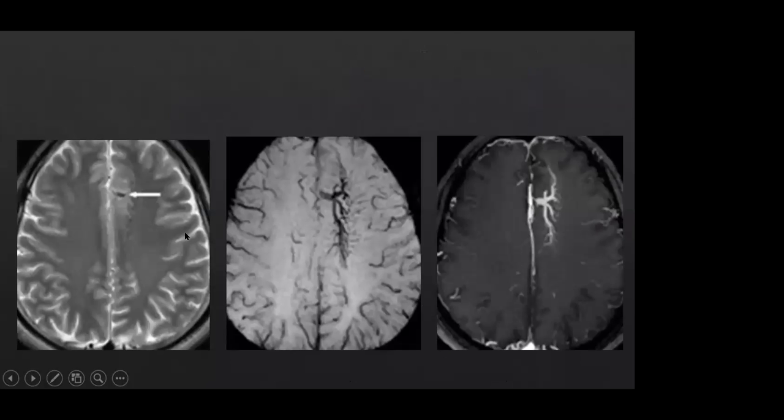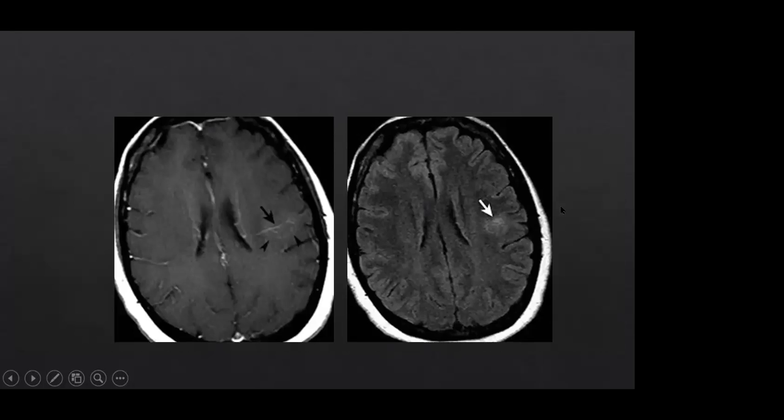And you can see them better on an MR scan. This is an axial T2, and you can see the low signal within that developmental venous anomaly main trunk. And this is an SWI sequence, just to show you how multiple tributaries join up together to form a common channel of a caput-like appearance, if you like, and seen again on this post-contrast scan to show the typical appearance of a developmental venous anomaly.